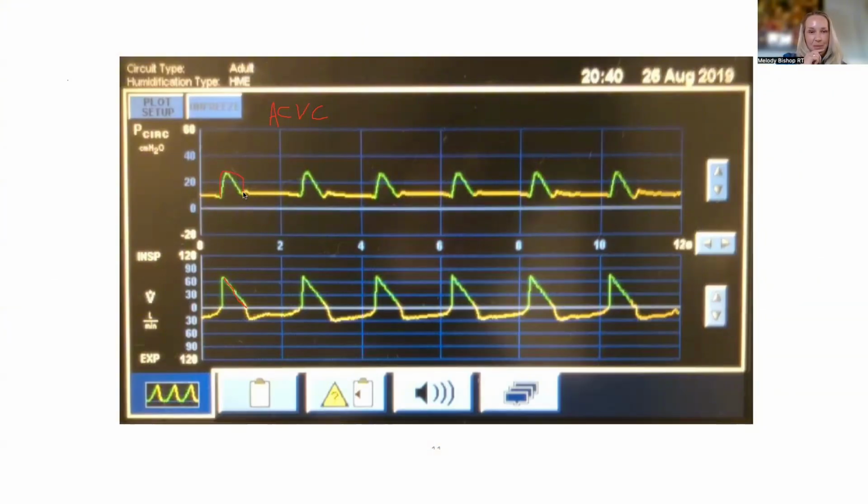Would you agree with what I'm drawing in red, that maybe it should look something like that? Something more like that. With the descending, you probably would have a little bit more of a slope up to a peak later. But yeah, I agree. You would have more of a tombstone, but I would have an asymmetrical tombstone. Yeah, like that? Okay, wonderful.